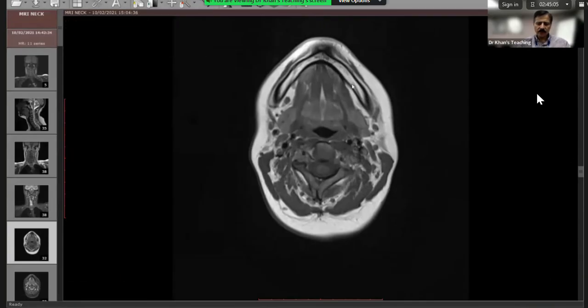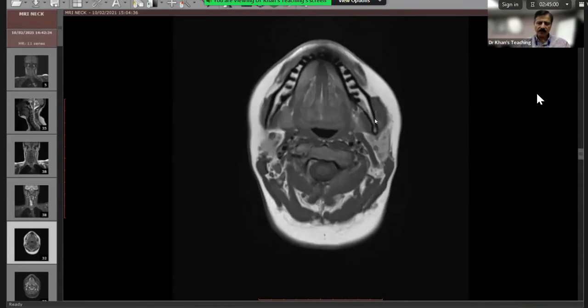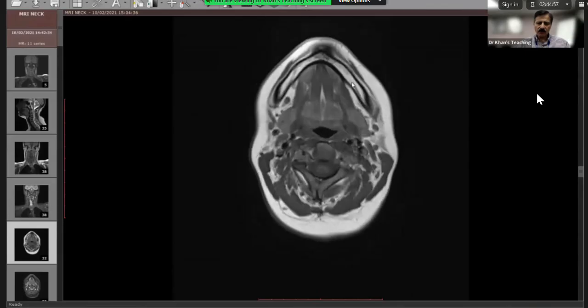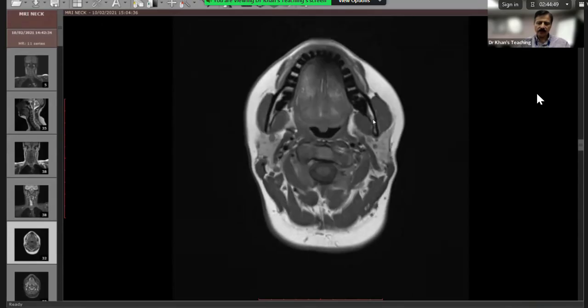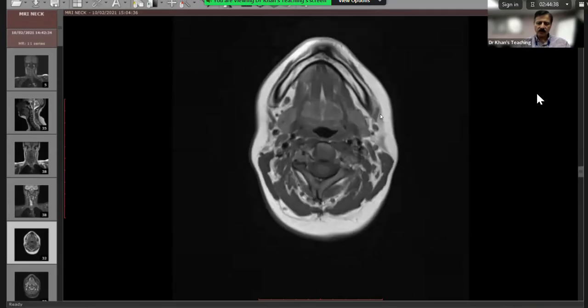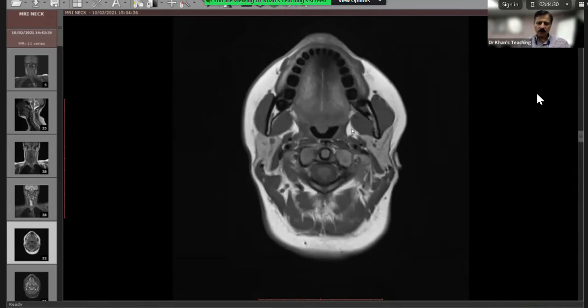that this is the mandible, and as we are going superiorly, you can see that this was the anterior portion of body of mandible, and as we are coming to the junction of body with ramus, you can see the alveolar ridge here, inferior alveolar ridge. You can see the teeth here, and on the other hand, you can see this muscle. So this is the masseter muscle, and this is the temporalis muscle. So now means that this is the masticator space.